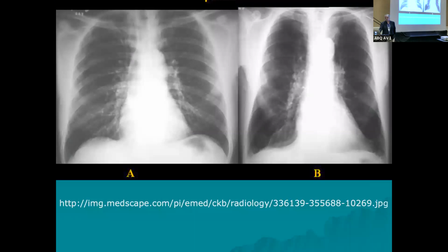Okay. Two lungs. Two different sets, by the way. You look right through here, you can see there's 1, 2, 3, 4, 5, 6, 7, 8, 9, 10 ribs, maybe, right there. On this one, it's hard to show on here. So there's 1, 2, 3, 4, 5, 6, 7, 8, 9, 10, 11 ribs.